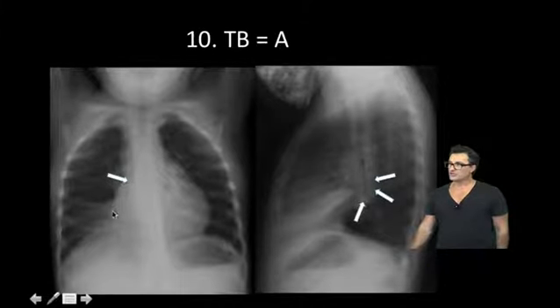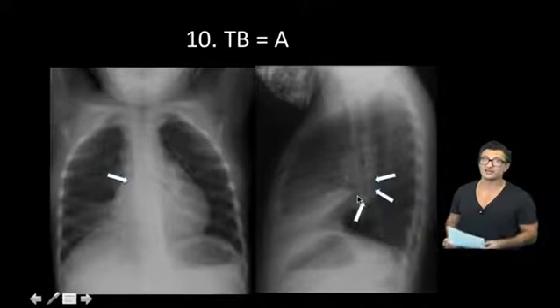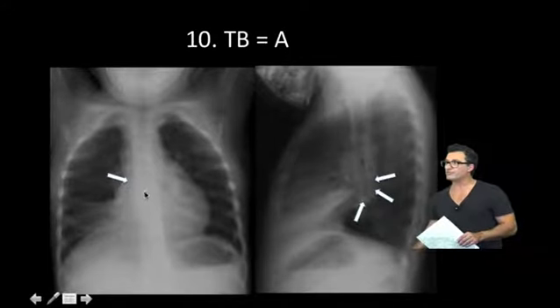Of course, we see the cardiac margin is missing. We see some density, and it's confirmed on the lateral. That's just parenchymal disease. Could be anything. So this is abnormal, could be anything, until you see the bronchial compression.